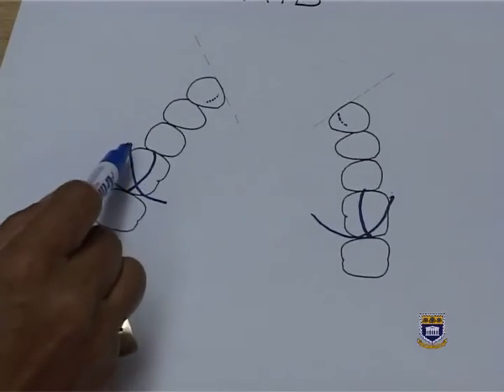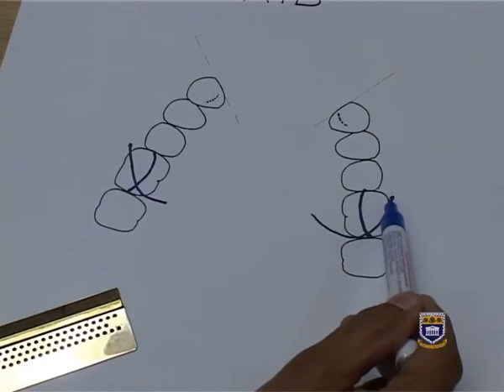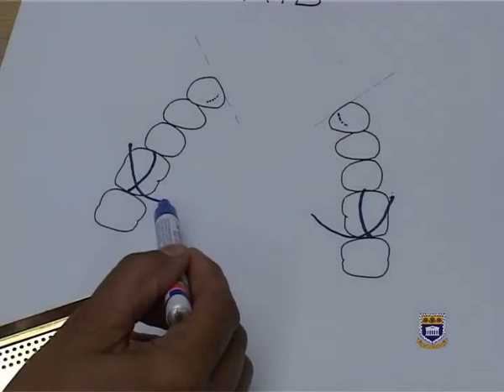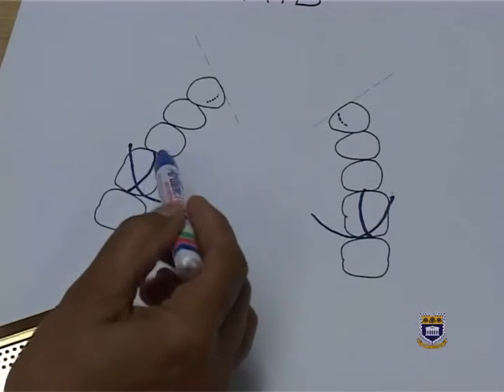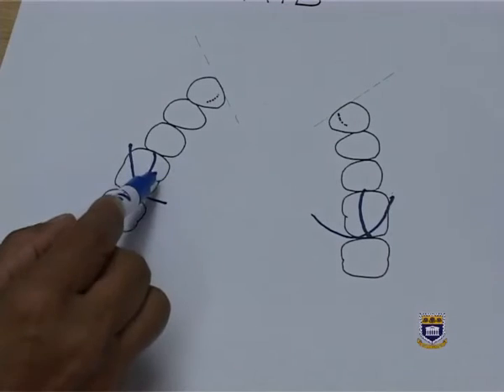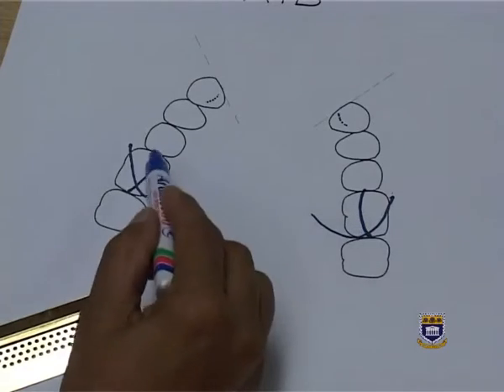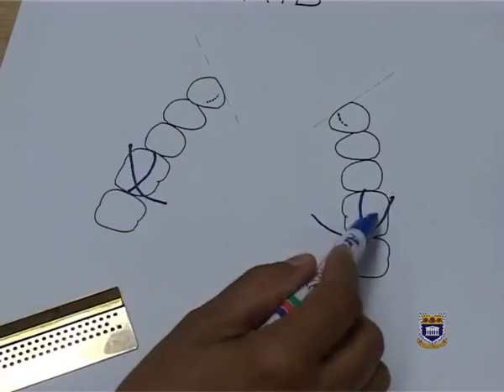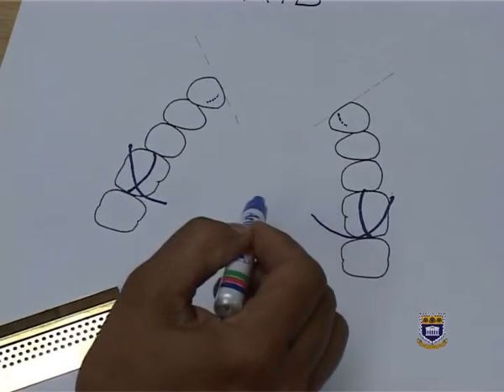So I'll have to indicate that the terminal third of my clasp is sitting in the undercut area. The same on the 2/6, the terminal third, and the bulk or the body of the clasp is not in the undercut area. My reciprocal part of the plate is not in the undercut area, so it is drawn above the line of the tooth. So I've got my active retention, I've got my reciprocation, I've identified my support.